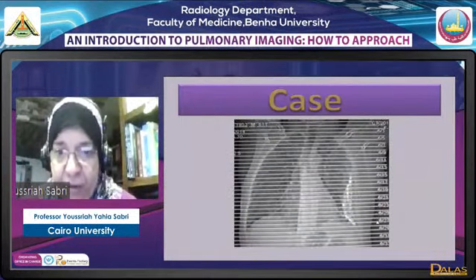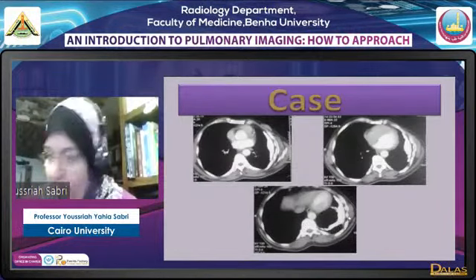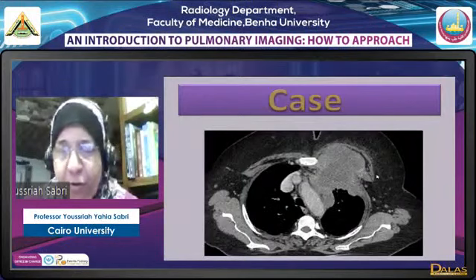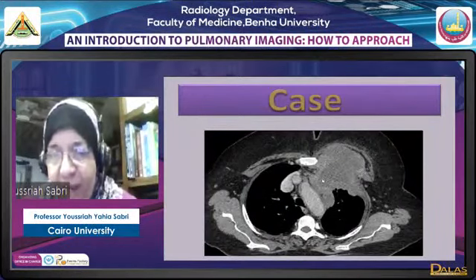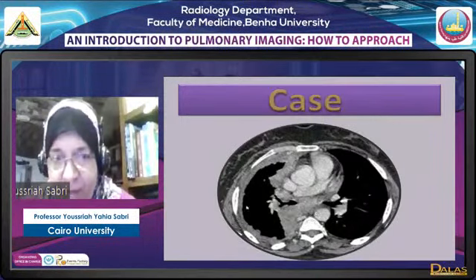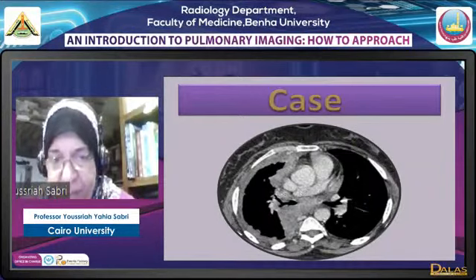In this case of mesothelioma, you can see the affection. The whole mesothelioma has shown this pattern of osteocartilaginous differentiation, and even the fissure is affected. Now, having a mesothelioma, we have to look at and comment on the mediastinal infiltration and the chest wall infiltration. Here we have a case of mesothelioma infiltrating the pericardium, the heart, and the mediastinum, as you can see.